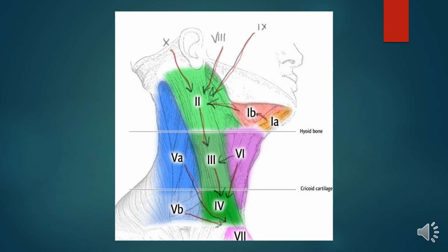So we have learned different levels of the lymph nodes, but it is also very important to know about the lymphatic drainage pathway of the lymph nodes in the neck. What you see is that all the lymph nodes which are supramandibular in location, that is parotid lymph nodes at level 8, buccofacial lymph nodes at level 9, and retroauricular and occipital lymph nodes of level 10, they all drain inferiorly to level 2 lymph nodes, that is in the anterior triangle above the level of hyoid.